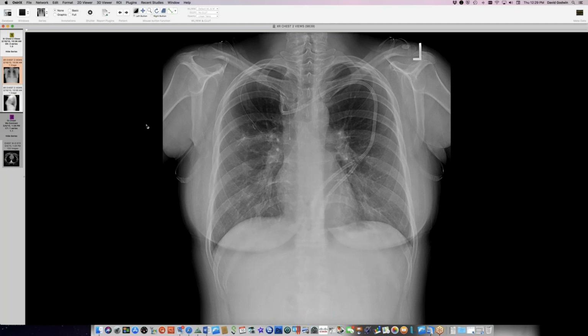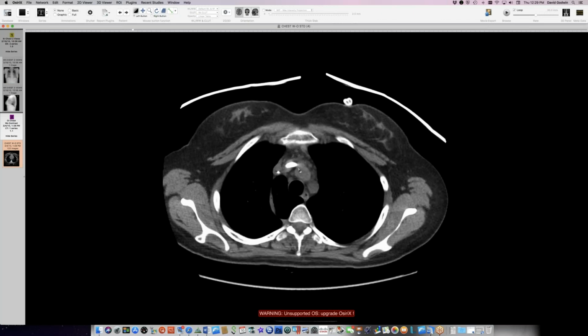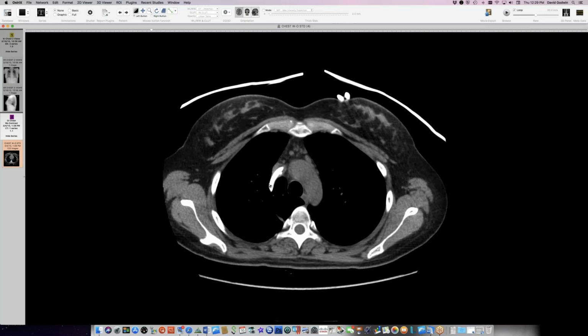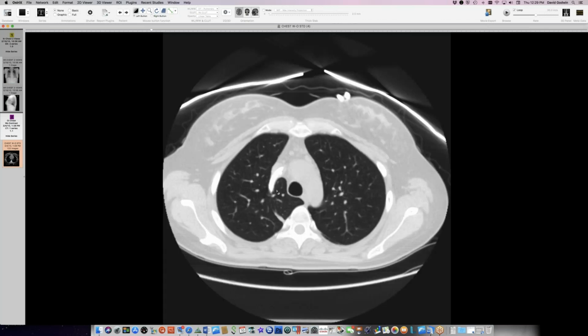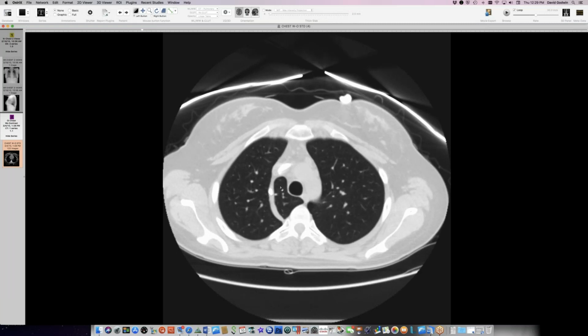Here are the 4 layers of pleura of this small azygous lobe. And on CT, here's the catheter crossing the midline in the brachiocephalic vein and then extending into the azygous lobe here, the vein in the azygous lobe. And this is the 4th case of this I've seen.